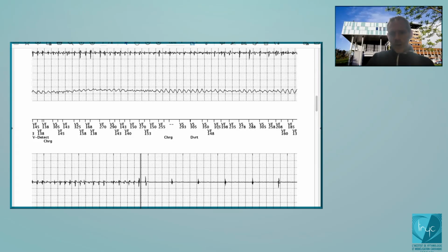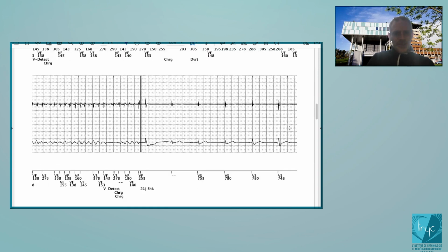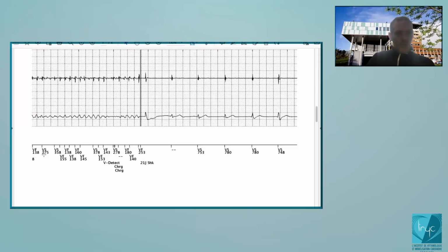So for example, here 1, 2, 3, but then there is still undersensing here. So these 3 you cannot count on this one since there are 3 here with VS. So you will restart to 0 at this time. Okay. So 1, 2, 3, 4. Undersensing, 5, 6, 7, 8. So now you have 8 out of 10, and you are lucky because there were only 2. So it's okay. Now you have verified once more the 8 out of 10.